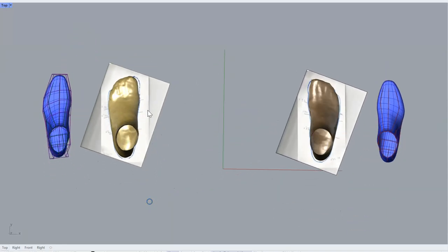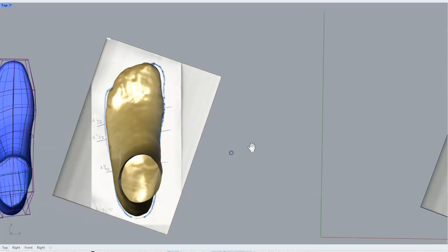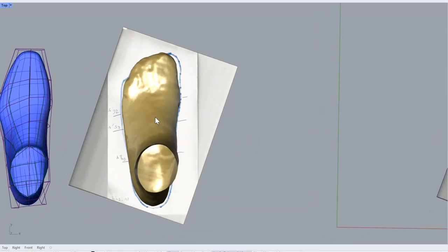The second thing I have here are those two blueprints. I use them to check measurements, although measurements are not very precise. That's not a subject. But you know, it's nice to have a reference. Also, when you cast a foot, there's a tendency that you squeeze the foot a bit too much. I try to avoid it, but you know, it's not always perfect.